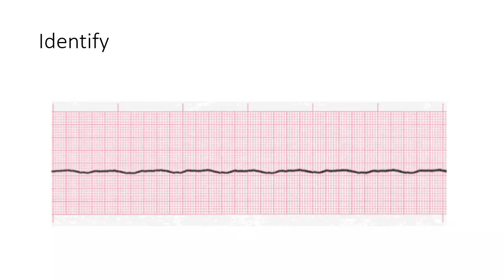So yeah, asystole. Now again, don't get thrown off by there is a little bit of movement on this particular line. That is not VFib. Okay. It's definitely not normal sinus, by the way. But again, we would just simply call this asystole, and nothing is happening. This rhythm is almost always a terminal rhythm, and especially if you see this rhythm in trauma, these patients don't come back. Usually between 1 to 5% get resuscitated.